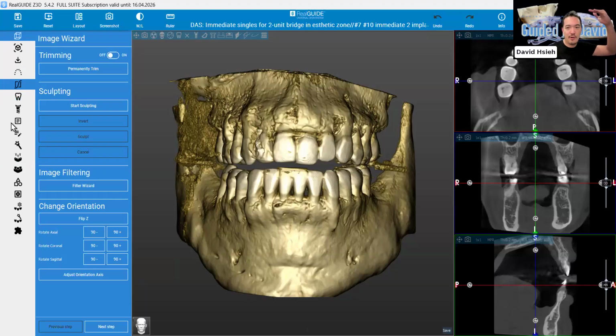You just go from the top all the way to the down, and you're done. That's it, right? That easy. All right. So let's get started.